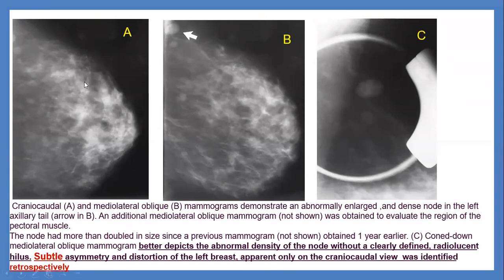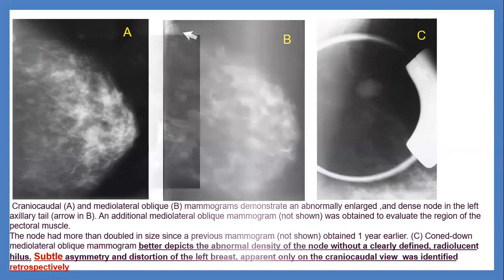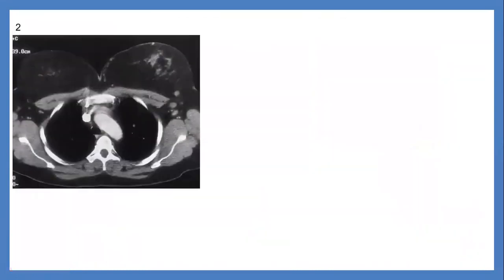They did not mention exactly where, but probably the same area I'm talking about. You see this area? Yes. This outer aspect is distorted. If you put a line in the middle and look at the outer and the inner, you will see the extreme outer showing some distortion. Okay, you'll go for ultrasound, but they have done this CT for the patient.